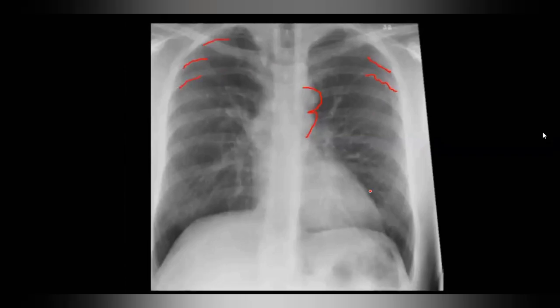Yes, how do you explain why you see rib notching here? So these are basically due to the engorgement of the intercostal vessels due to a bypass of the blood, because there is stenosis at the level of the aortic arch. Usually it's not the aortic arch. It can happen in the aortic arch, but usually if it's in the aortic arch, you will not see bilateral rib notching. You see unilateral, depending on the location. So it is usually preductal and postductal, in the isthmus, aortic isthmus stenosis. Right, sir. There's engorgement, diversion of flow into the intercostal arteries.